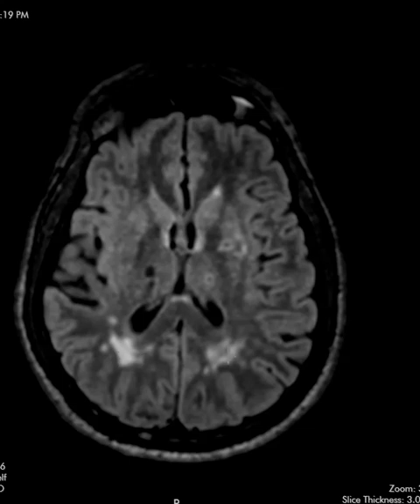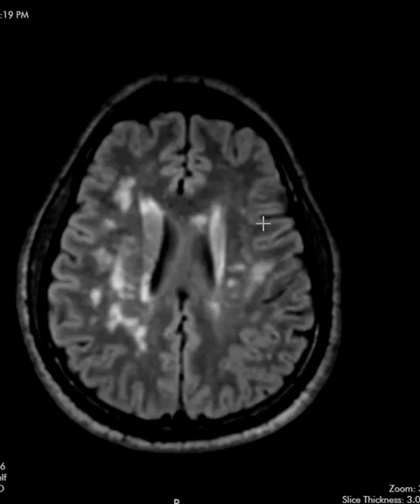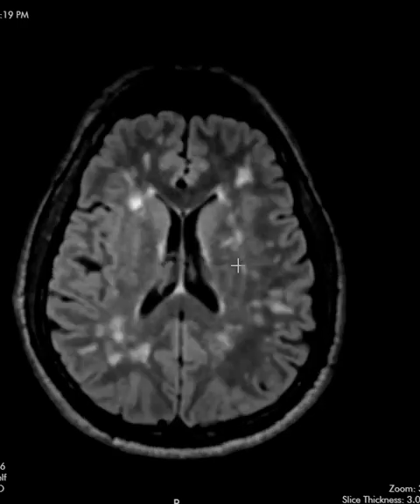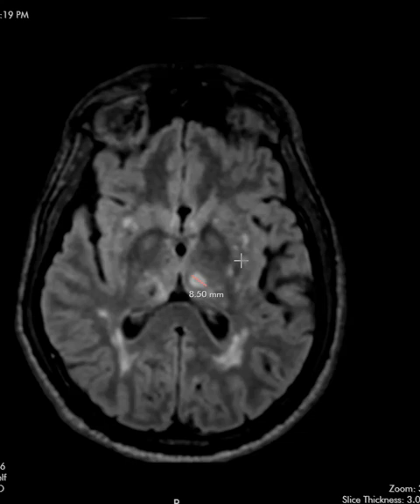There's a posterior white matter here, a little bit of atrophy with chronic MS. We're also looking at atrophy, so a very severe diffuse white matter disease. And a little horizontal one here, looks like a Dawson's finger. So this looks like more of an advanced MS, and with this horizontal lesion here and other lesions in clinical history, this is consistent with multiple sclerosis. Sometimes you can get lesions like this that look like tumors or infarctions, and we call this tumefactive MS when you see a big area that's rounded.